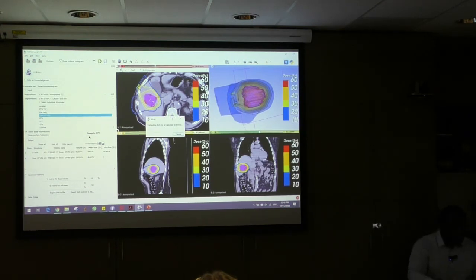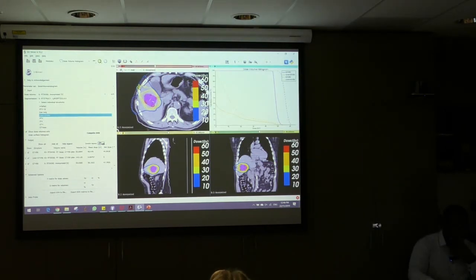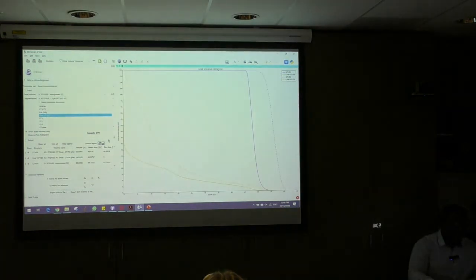Doesn't take very long. So once this is done, we can visualize the dose volume histogram data. And to make just this visible, you can click on the switch on this particular button, and it will just focus in on the data for the dose volume histogram.